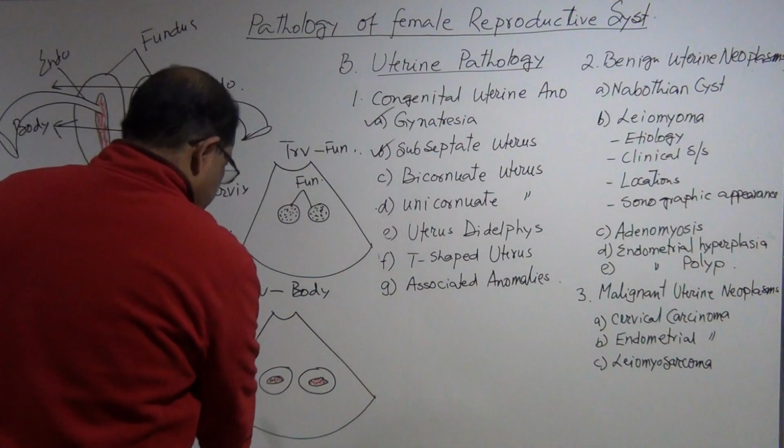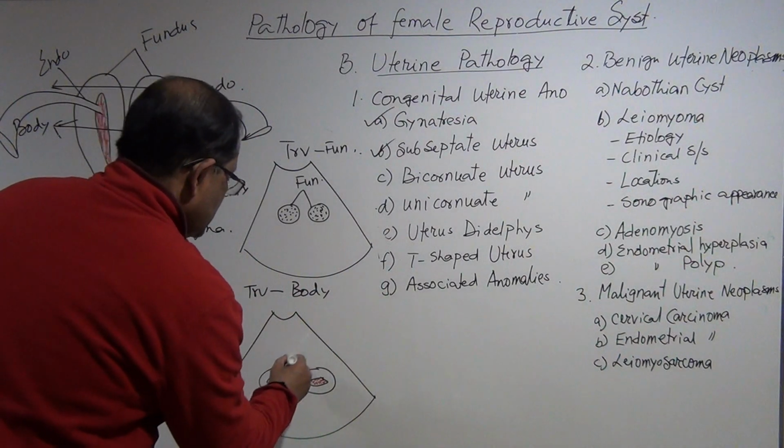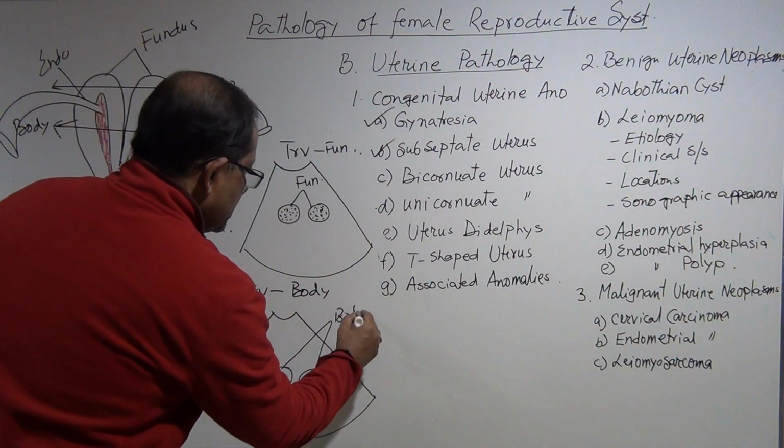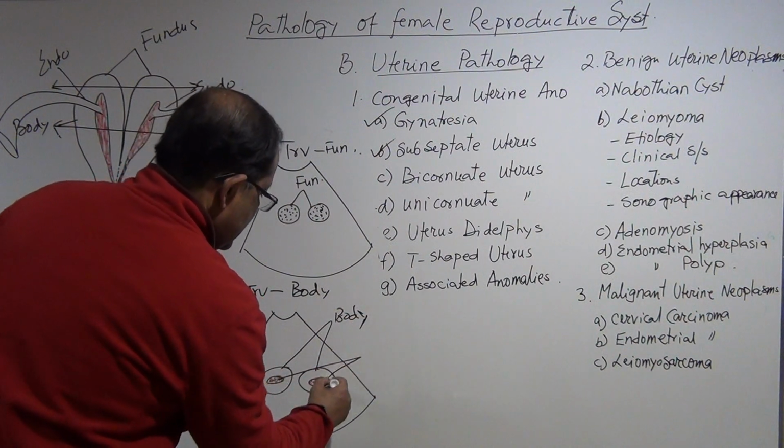You will see it's a body and these are endometrium.